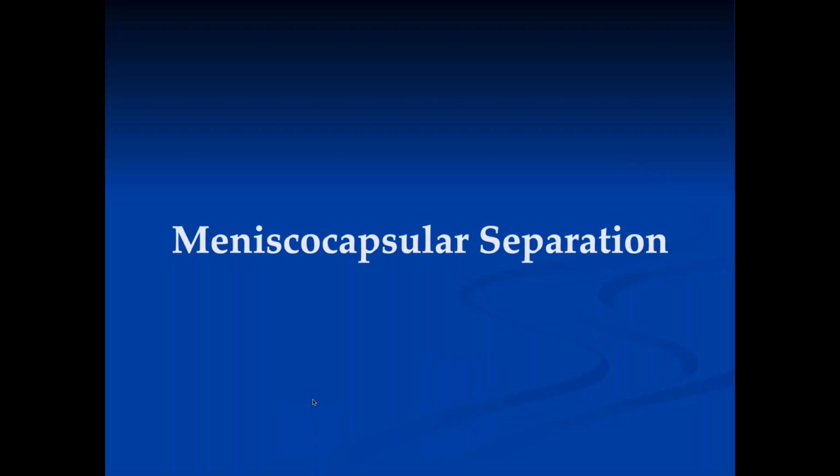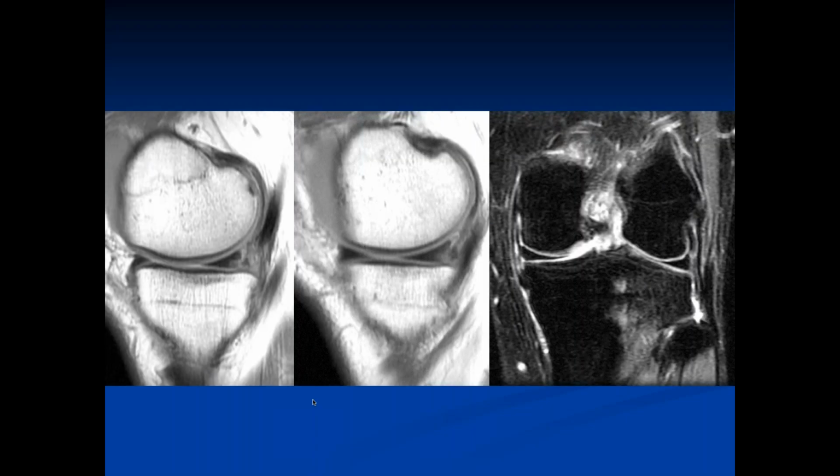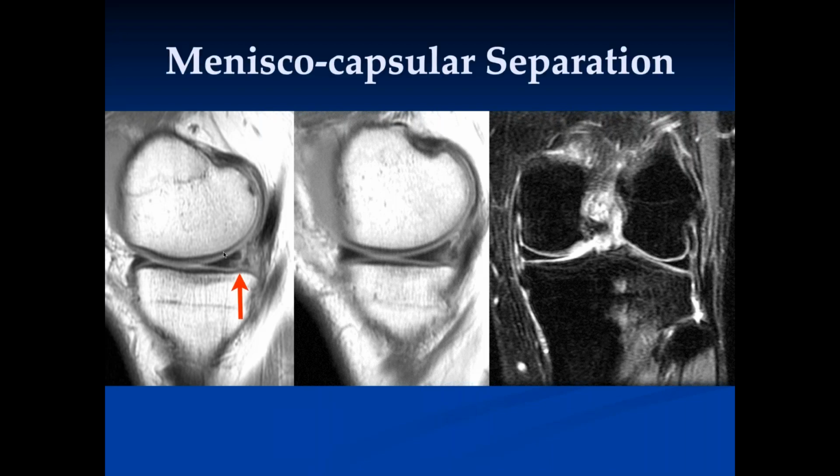And we'll talk a little bit about ramp tears. So that's in the category of meniscocapsular separations. Here we can see a vertical tear of the posterior horn, primarily involving the inferior surface here, which, as we heard, could be a little bit more stable than the superior involvement, but this would be a peripheral tear, and there's probably a meniscocapsular separation more superiorly. In the setting of an ACL tear, which we have here, this would be one of the varieties of ramp lesions.